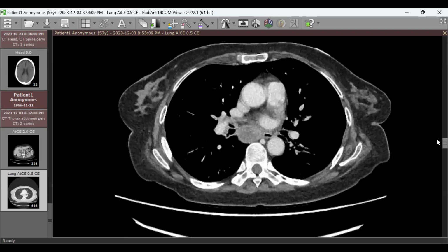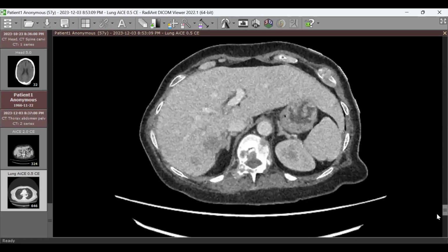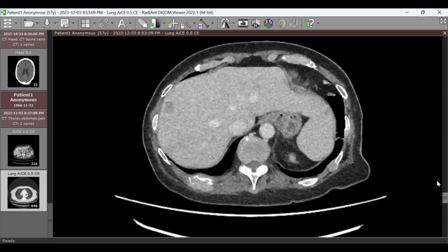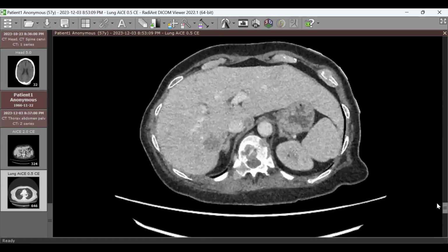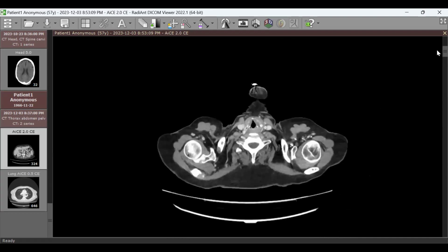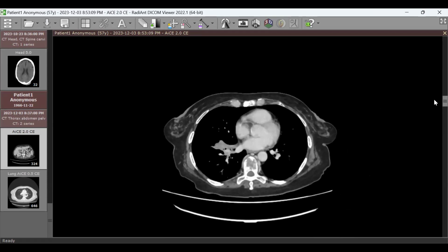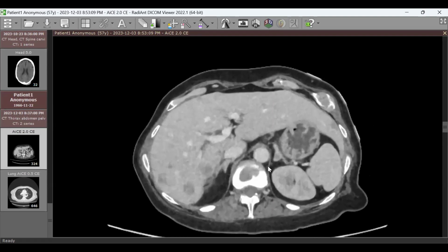And let's go back to the abdomen. Adrenal, yes, we should look for it. Suspicious adrenal here, right? Yes, suspicious probably here, but anyway, what about the liver? Liver, yes, there are multiple hypodense, hypoenhancing lesions, most likely metastasis. And as we can see, there are many lesions here, like the chest wall, and as we said, the liver, adrenal. Also, they have some lymph nodes in the upper abdomen.